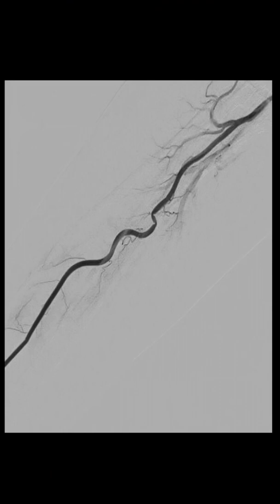So, as we discussed earlier, the patient has a left carotid artery stenosis. You have to know 2-3 things. One, whether the stenosis has progressed, whether it has increased. Second, whether there is a risk factor for the stenosis, like a plaque rupture with a superadded thrombus, or whether it has gone into a total occlusion.